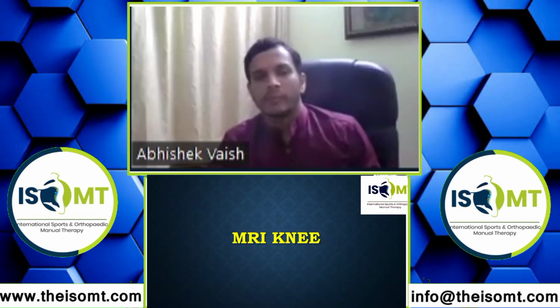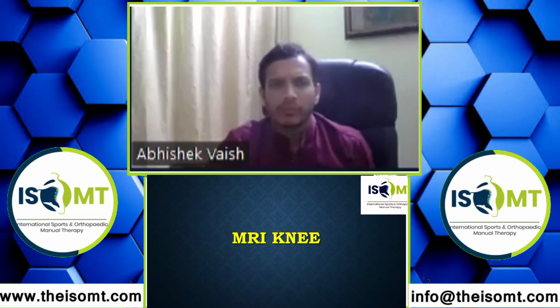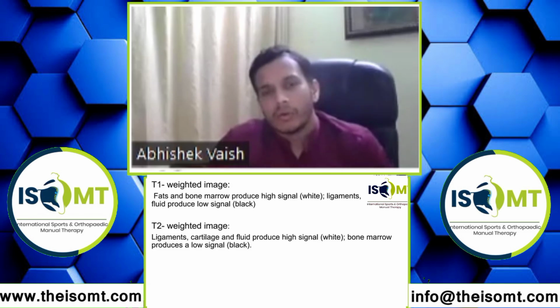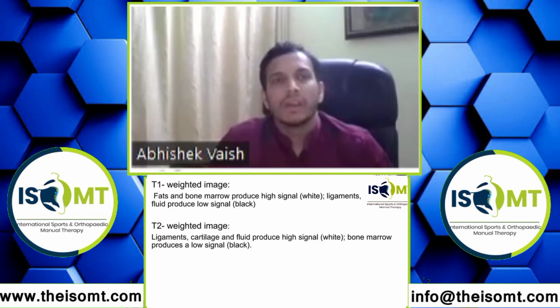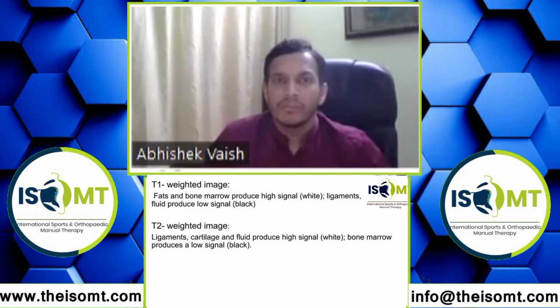With these interesting cases, now we move on to some basics in knee MRI. So what should you think about while reading an MRI? MRI is a very major topic which we cannot cover in a short time, but I will try to give you a brief overview. First of all, the most important thing is you should know which image you are reading.